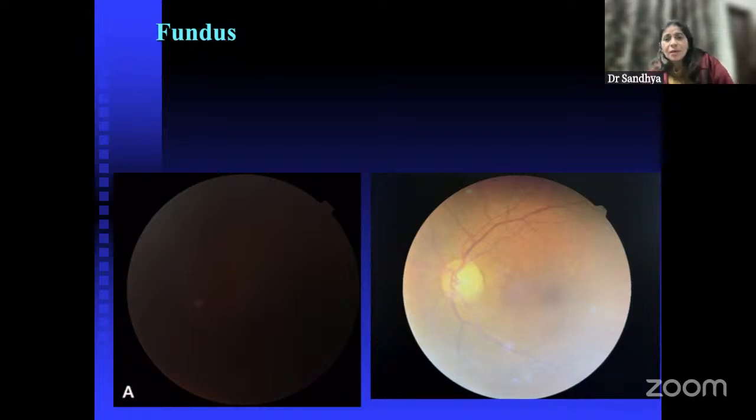And the other eye, now you see, if this was purely diabetic retinopathy, you could have seen some advanced changes of DR in the other eye also. Whereas the other eye shows a fairly low degree, probably a non-proliferative, very early diabetic retinopathy. So this doesn't match with this eye. Immediately it comes to your mind that probably there's something else happening in the eye with hemorrhage. The cause of hemorrhage could be something else, not diabetic retinopathy.